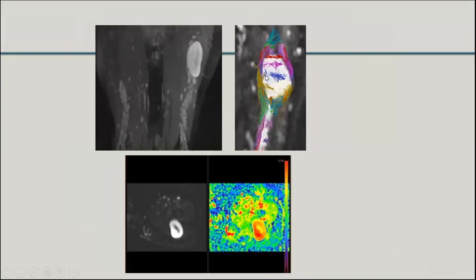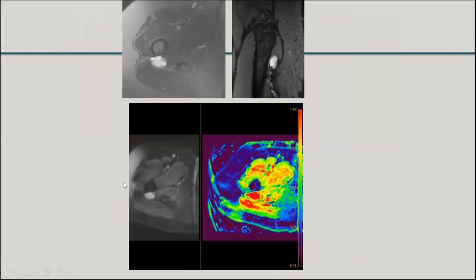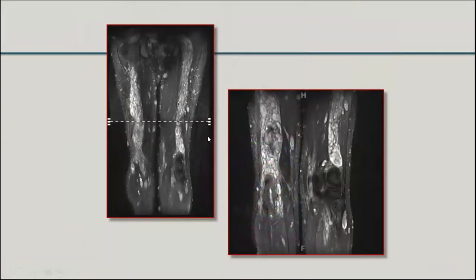And these have less tracts preserved. This is a perineurioma in an older patient. Again, a red tumor. It's a benign tumor. Now, this obviously is malignant because it's a large tumor, ugly, heterogeneous in NF patient.